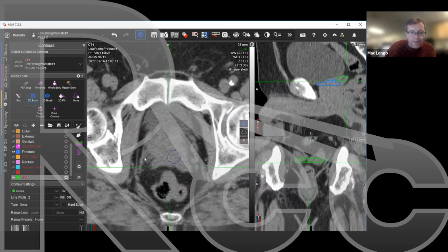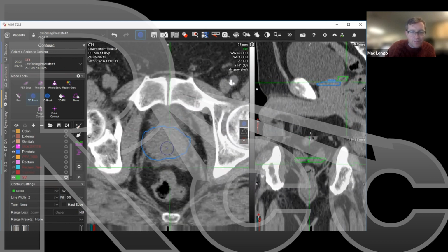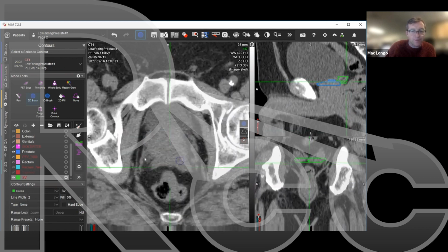Where I think this prostate seminal vesicle interface, especially in older men, can be really challenging. Where does this seminal vesicle start, or where does the prostate stop? And my approach to that is, if I'm unclear about whether tissue is seminal vesicle or prostate, I err on the side of treating it as prostate, because I want to make sure it gets a reasonable dose of radiation therapy.